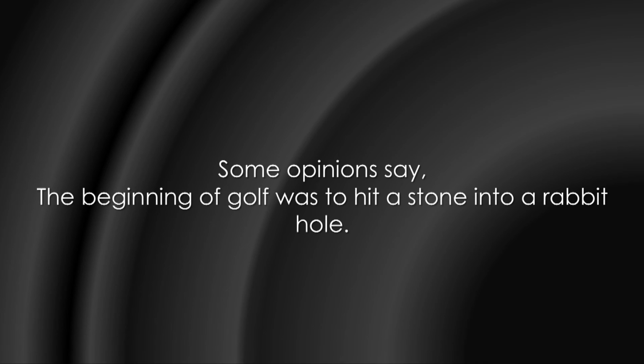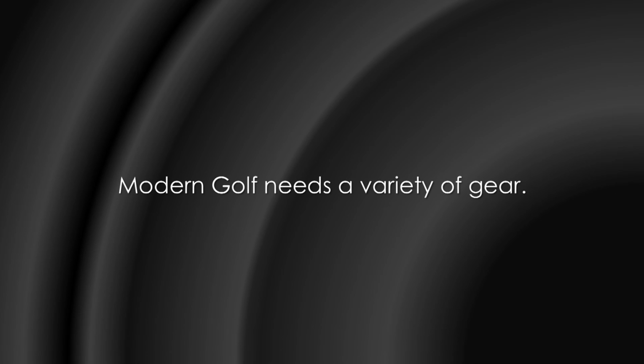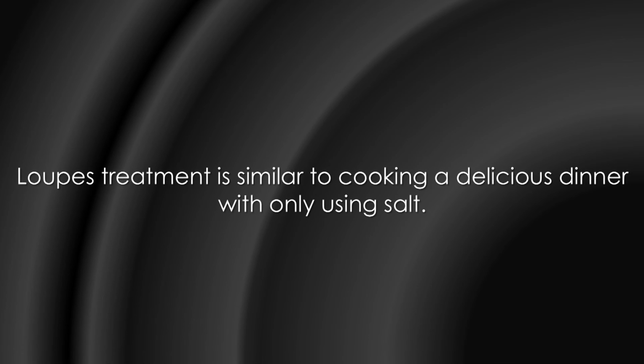Some say the beginning of golf was hitting a stone into a rabbit hole. After the invention of golf, there has been much innovation that completely changed modern golf as we know it today. Modern golf needs a variety of gear. Loupe treatment is similar to playing 18 holes of golf using only a 7-iron. Loupe treatment is similar to cooking a delicious dinner using only salt.